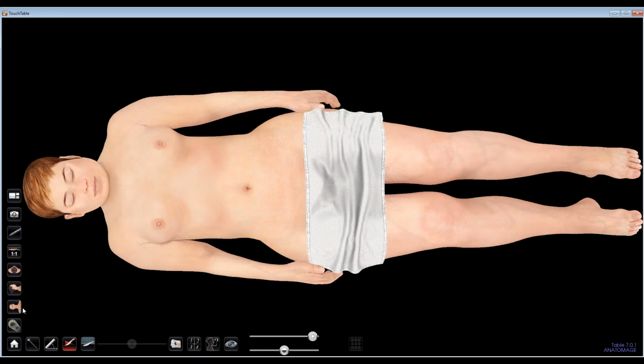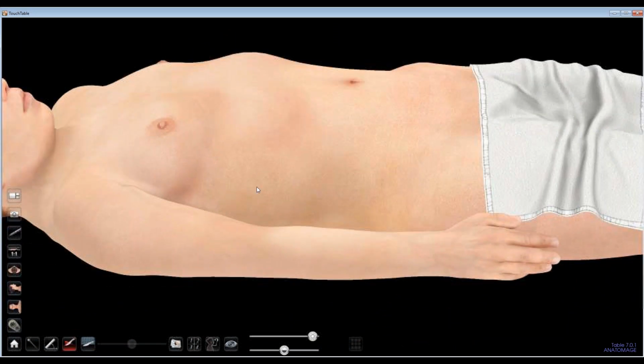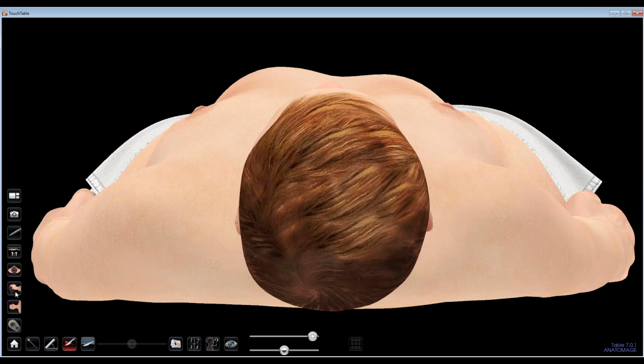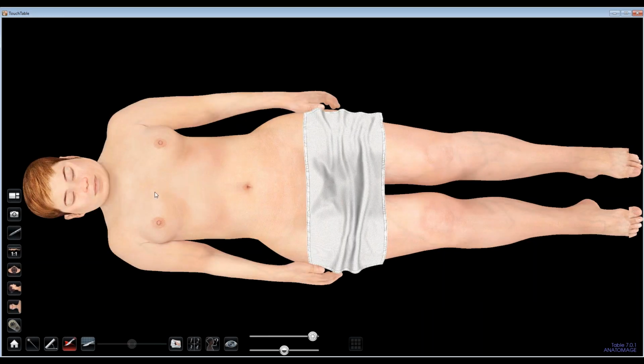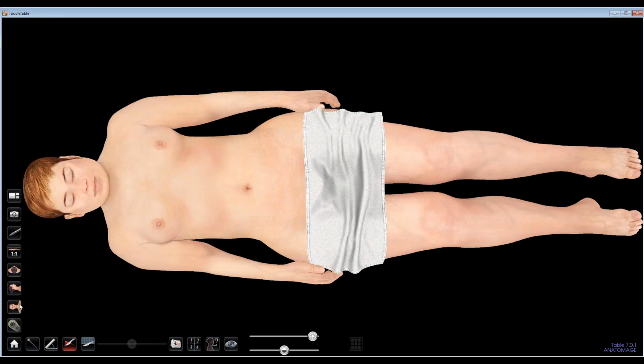All right, we're just going to jump right into, actually, sorry, a couple more things here. So you probably noticed I was all zoomed in kind of sideways here. If you want to quickly reorient your cadaver back to one of these standard positions, we've got some icons here on the left-hand side, coronal, sagittal, axial, these different planes. Click one, and that'll always reposition into a standard view. Make things easier rather than you trying to rotate and move and bring it all back to default.